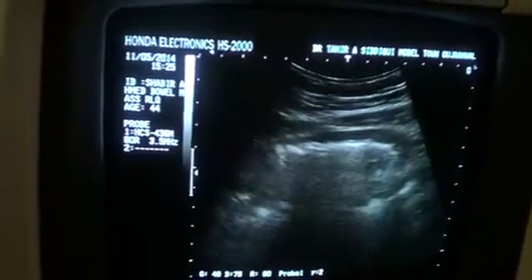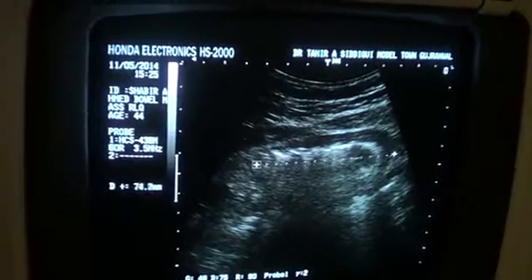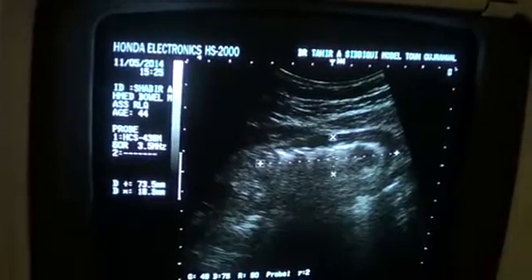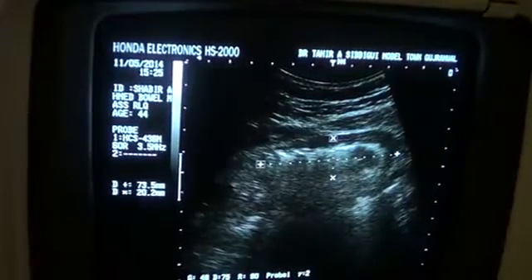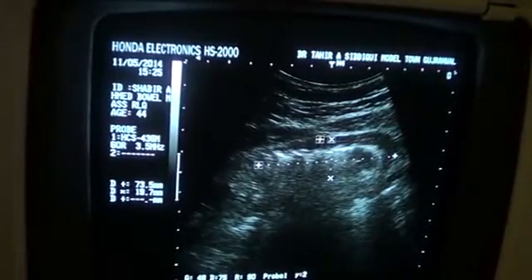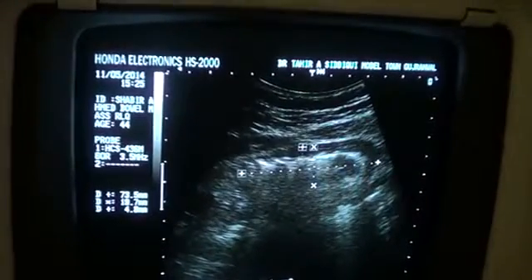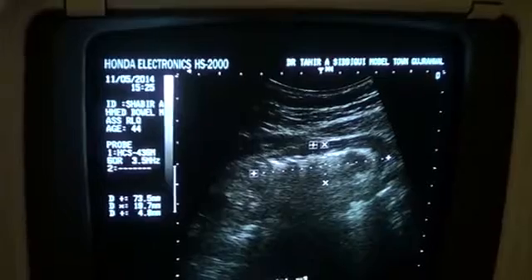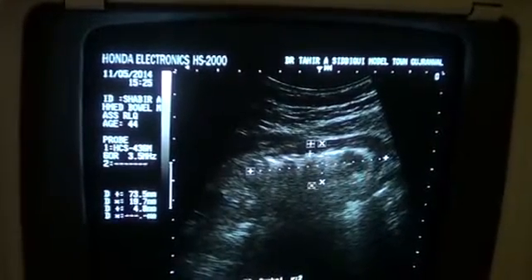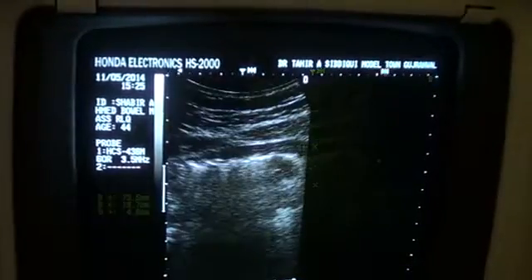However, a segment of bowel measuring approximately 7.5 centimeters by 2 centimeters with trapped air within its lumen and wall thickness of 4.8 millimeters is seen extending from the lateral margin of the cystic area of the bowel mass in midline anteriorly.